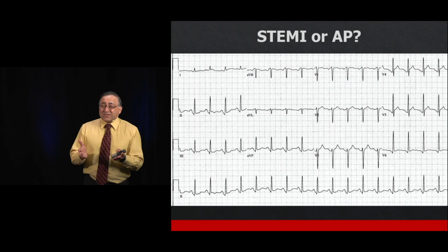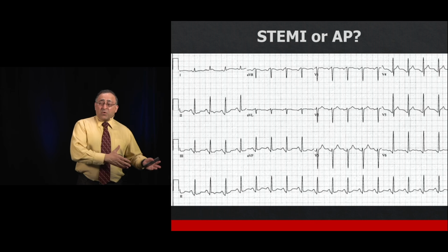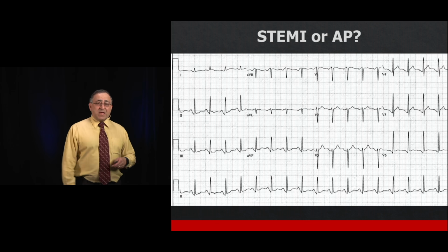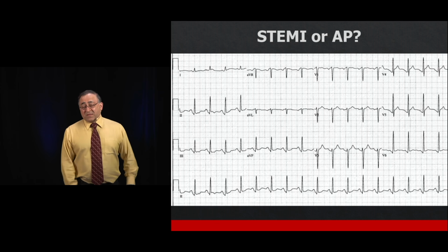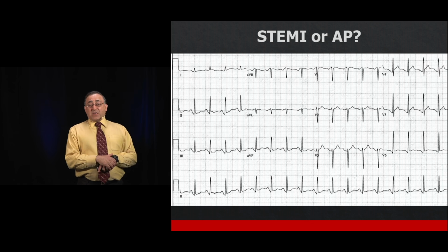I said, "Ma'am, I've got to ask these questions. It's so important for me to try to figure out if this is your heart or if it's something else." She's not having any of it. So I finally give up. I leave. But at the very least, we're going to get an EKG. And this was the EKG that we got.